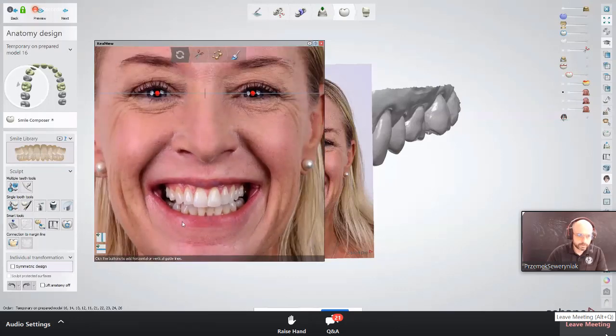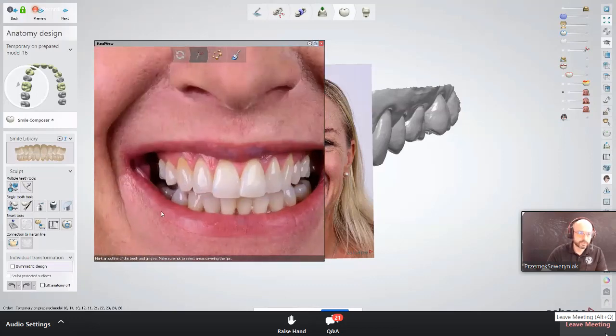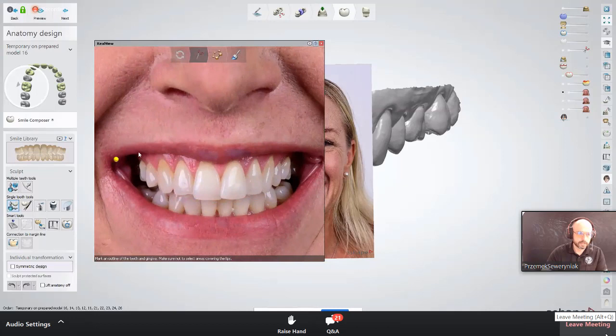I'm also going to put some extra lines, which I use to see the lengths of the right and left sides, which make this easier for me to adjust to the correct length. And then we're gonna use the scissor tool, and we're gonna put the outline on the lips just as we did before.